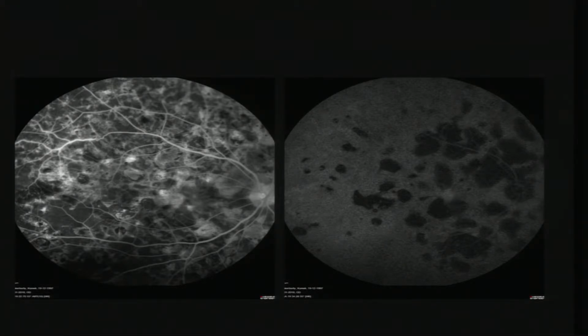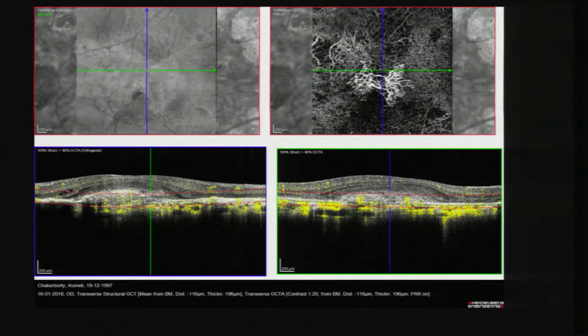Now the question is, there is a lot of choroiditis which is healed. There is a complaint of recent metamorphopsia. You are in doubt based on the OCT image. You're not too sure whether it is a membrane or not a membrane. Would you inject or would you not inject? This is where the OCT angio helps you in making a clear-cut decision.